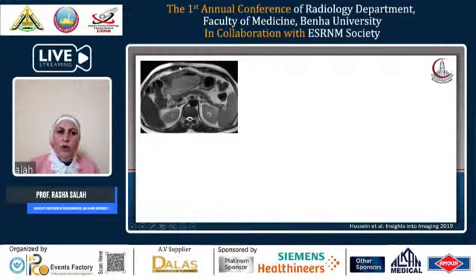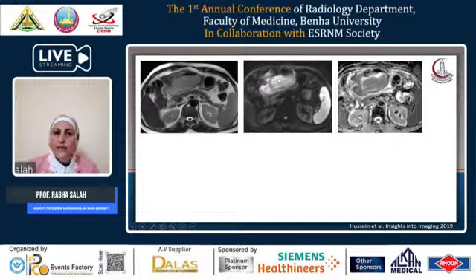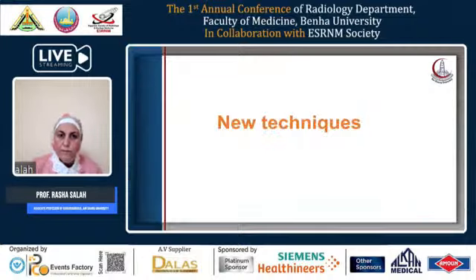This is an example of hepatic abscess after TACE formed at the site of the treated lesion, and it was confirmed by the diffusion weighted image as a true restricted diffusion with air inside and no appreciable enhancement. The lesion was well treated, but unfortunately there was an abscess formed at the site of the lesion, and it was tapped, and it was proved to have pus inside, and the patient improved after the aspiration of this abscess.